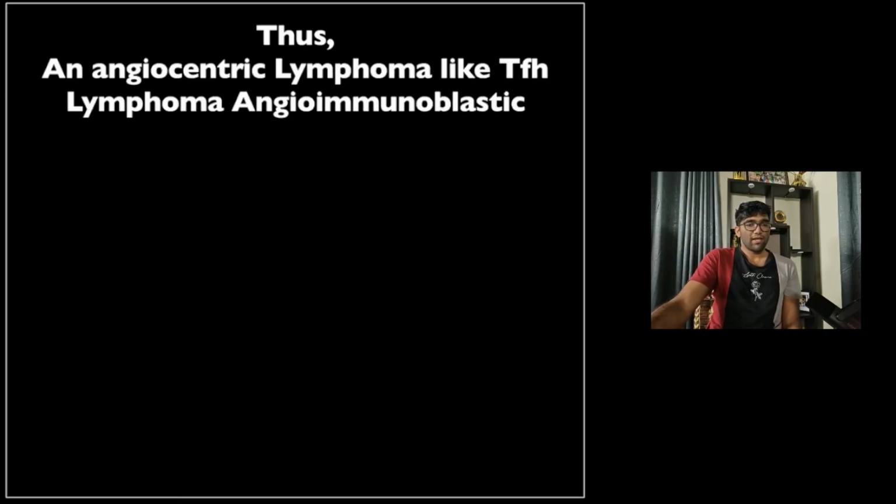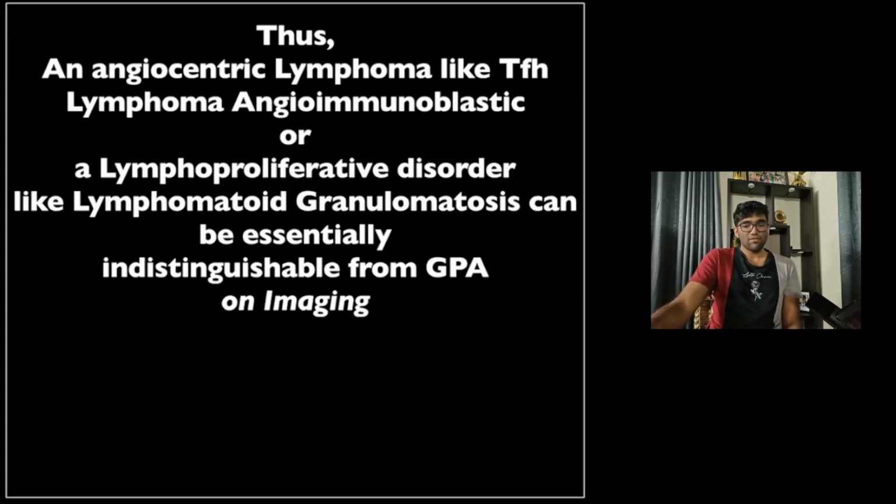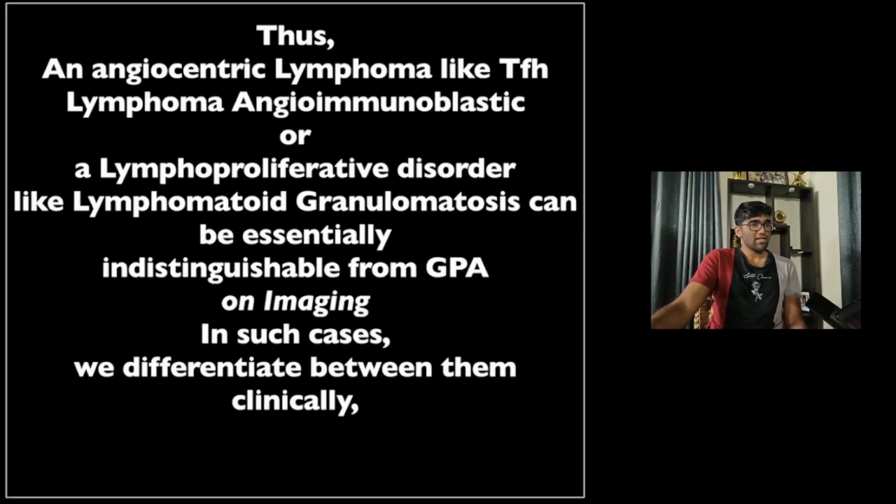Thus, an angiocentric lymphoma like TFH lymphoma, angioimmunoblastic, or a lymphoproliferative disorder like lymphomatoid granulomatosis can be essentially indistinguishable from GPA on imaging, except for the mediastinal lymphadenopathy. In such cases, we differentiate them clinically and then based on the presence of mediastinal lymphadenopathy.